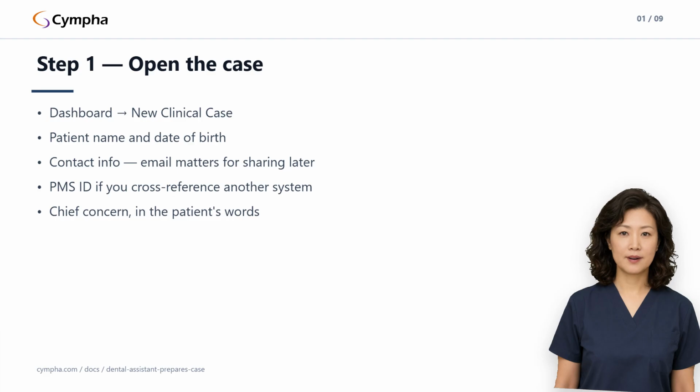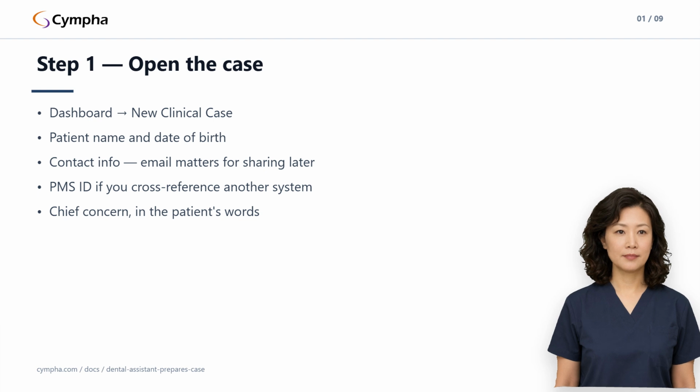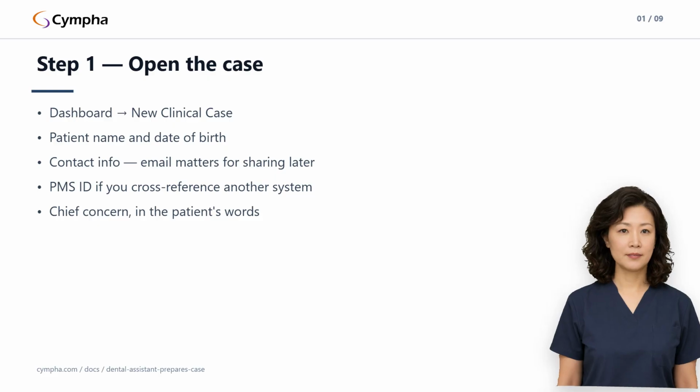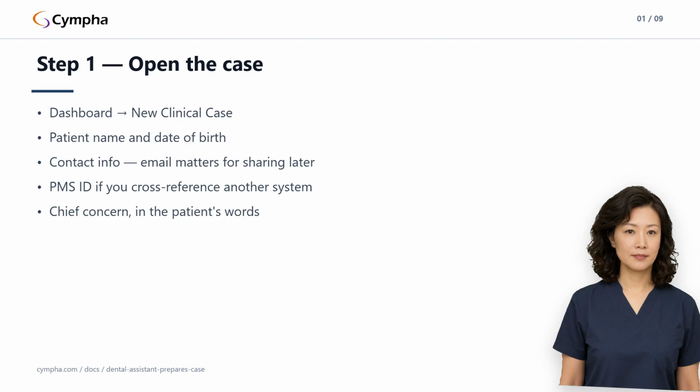If your practice cross-references another practice management system, enter the PMSID so the two systems can be matched up. And the chief concern, in the patient's own words, pull it from the booking notes or from what they said at reception. Click Submit. The case is created with a clinical status. That's the resting state for doctor-managed clinical cases, and from this moment, everything you upload lands on this case automatically.